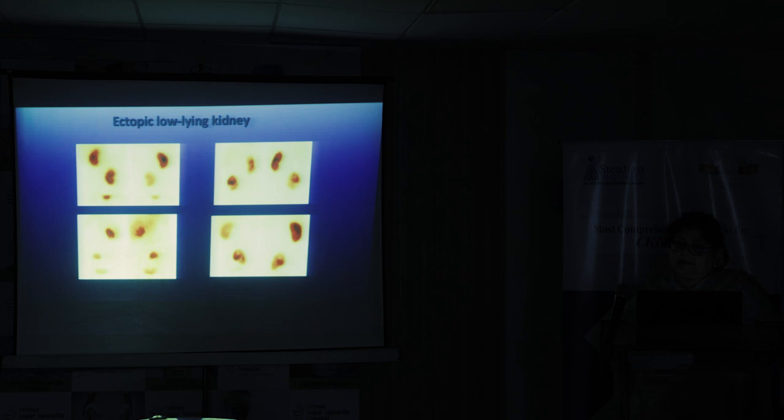This is an ectopic kidney, a low-lying kidney. So this is not a ptotic kidney. This is always ectopically placed at the pelvic brim.